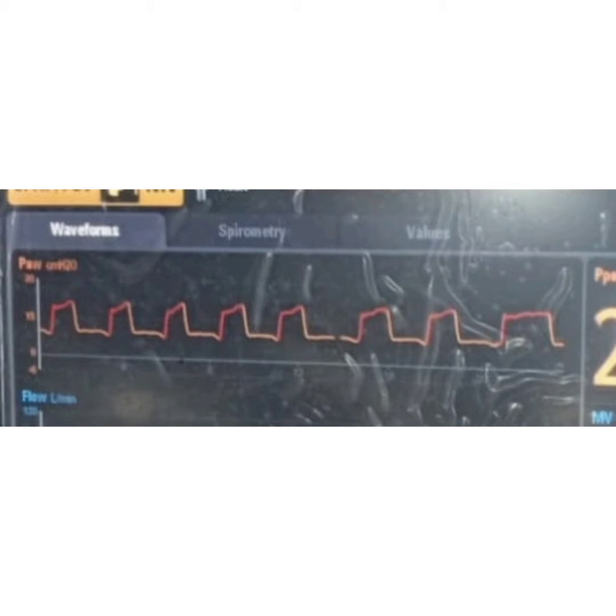Here we can see that the flat line indicates PEEP, the positive end expiratory pressure, because during end expiration, the pressure must drop to 0, but here it is a flat line above the 0, somewhere around 8. So, the PEEP is present here.